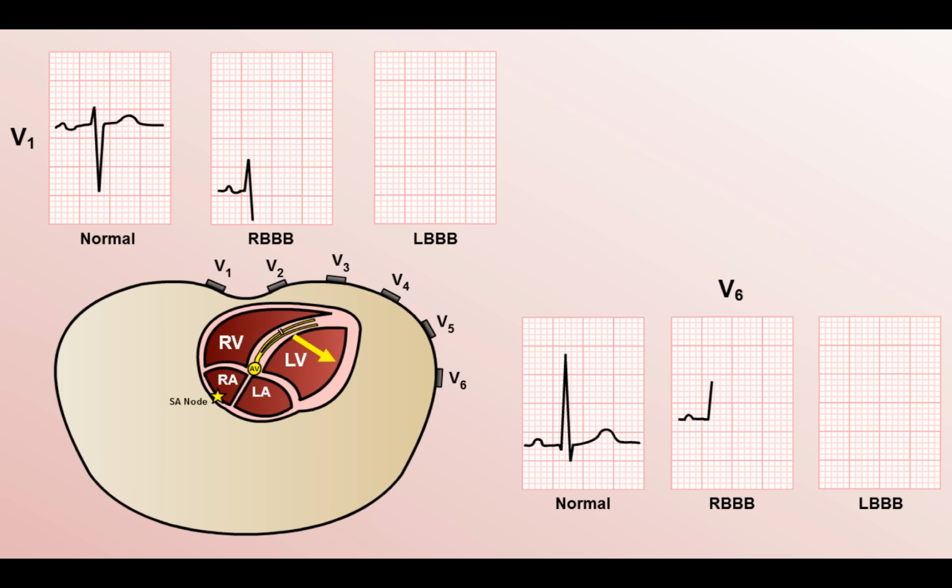Here is an example of a left bundle branch block with the broad R wave and deeply inverted T waves in 1, aVL and V6. And there is the deep S wave with ST elevation and prominent T wave in V1 and V3.